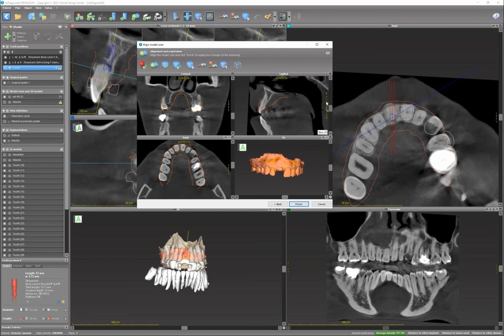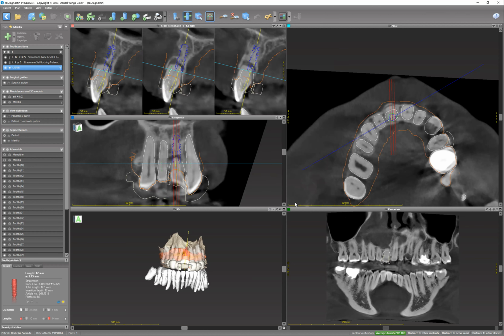There is no discrepancy between them. I press finish, and now we have the two. Now, immediately you can see you have the tooth that CAREstream has generated. So I'm going to turn off the guide. And you can see that this is the tooth that it generated. So now we have to connect it, make it better, fill up this gap, and all of the good stuff.